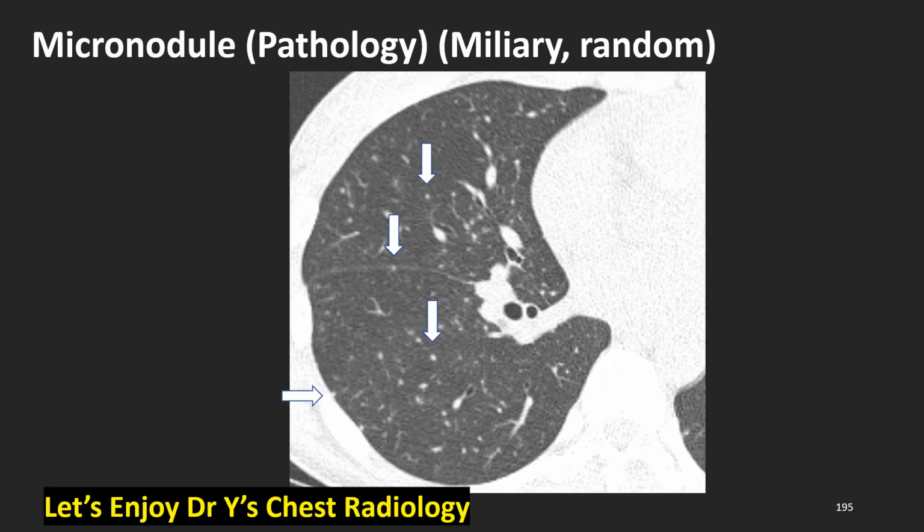Micronodule pathology, miliary and random. Arrows indicate micronodules from miliary tuberculosis.